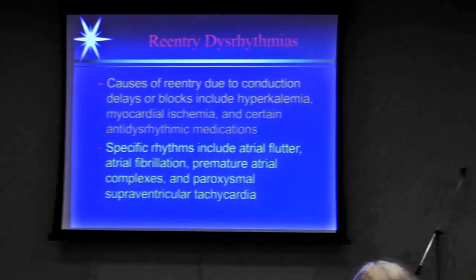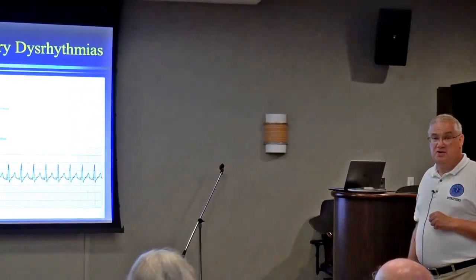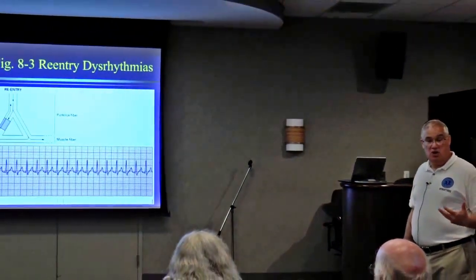This is something that they will find in an electrophysiology lab. Makes no clinical significance to us why it happens. It only just matters what happens, which is the heart starts beating very quick. And we know when the heart starts beating very quick, the blood pressure drops because of the ventricular filling time. Is there any issues when you have a rhythm like this with the atriums not contracting? No. Atriums are probably contracting. The problem here is the ventricles are not filling with blood because the heart rate is so fast.